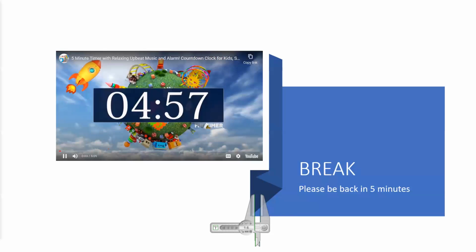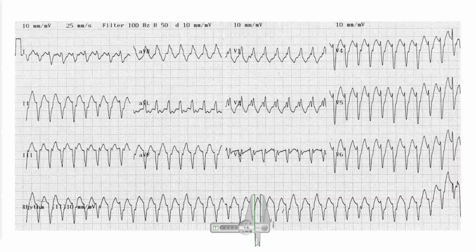All right. And the other question was, does the delta wave only appear in lead 2? Actually, it would appear in any lead, okay? But most significantly, in the V leads is where you would identify these particular beats, okay? Okay, so let's move on. This is a tachycardia of some sort, isn't it? The rhythm or the rate is fast.